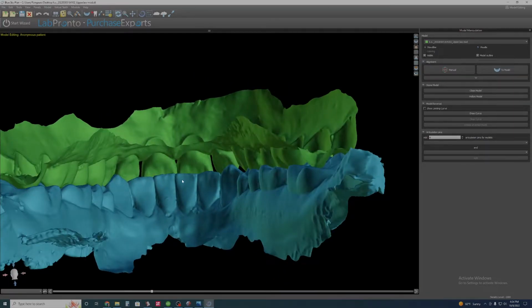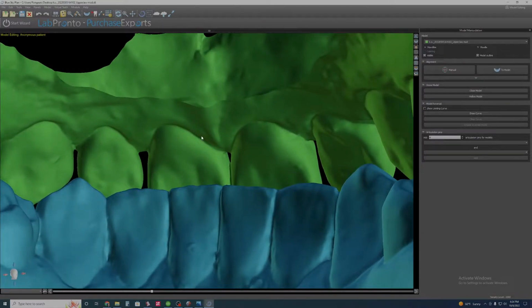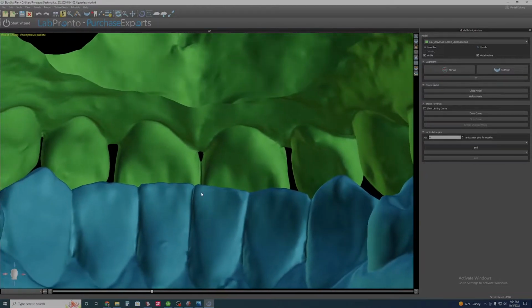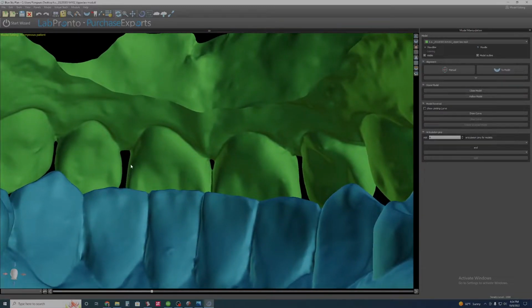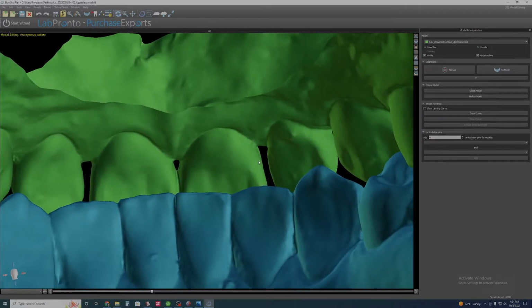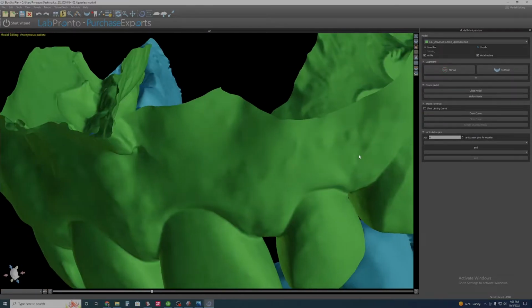As you can tell from the backside, there's a lot of enamel that I don't have to prepare necessarily, and it's intact, and there shouldn't be much need for that unless I were to start bringing in the interproximal areas and the contacts, where I might have to get around the mesial and the distal a little bit more heavily than a conventional veneer prep, but the direct palatal side, I don't feel like I'm going to have to touch that.